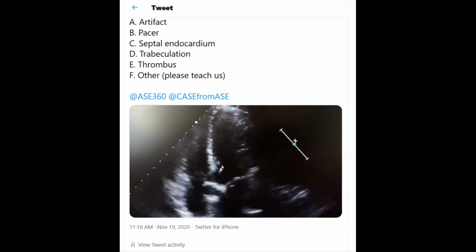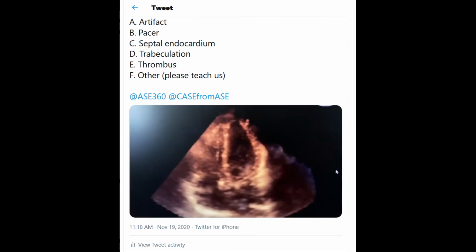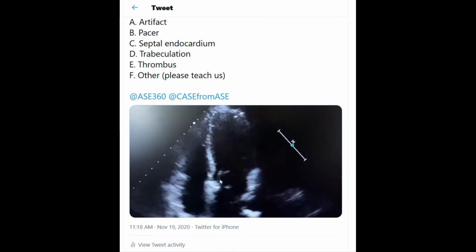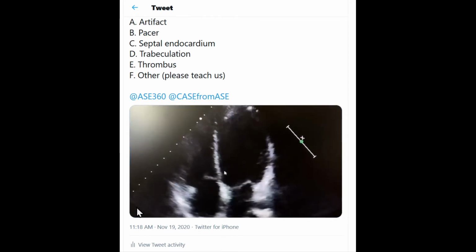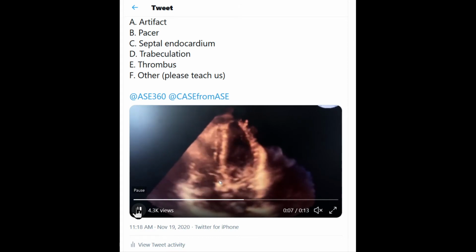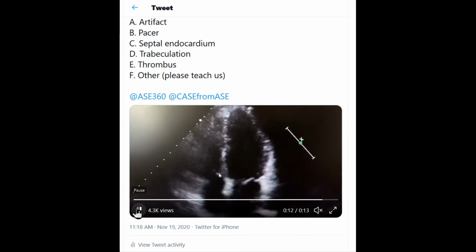As I let this play, I'll tell you some of the feedback that I got from people that participated in this quick question. I had 15 A answers, 9 B answers, 14 C answers, and then a couple of others that predicted thrombus or other. Some of the discussions I heard, which were pretty funny, were the fact that it looks like a pacer, but it's going in the wrong direction. Ken actually said he thinks it looks like a pacer, but he suspects that I was trying to fool you into thinking that it looked like a pacer, and of course that is what I was doing.